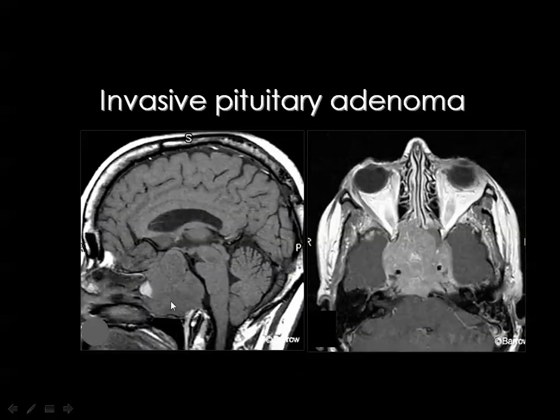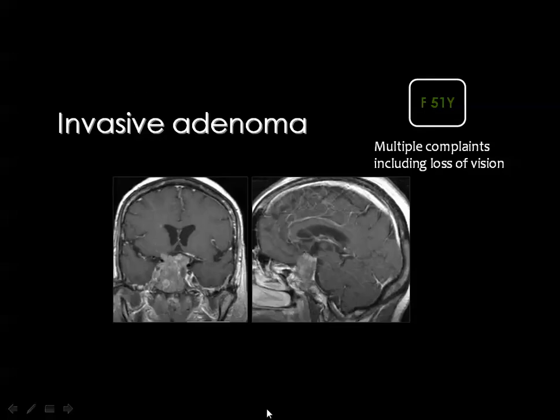This is a very big pituitary adenoma occupying the region of the pituitary gland and extending into the suprasellar area, reaching the optic chiasm, and also invading the cavernous sinuses bilaterally. You see the tumor tissue lateral to the internal carotid artery on both sides, and it has also invaded the skull base, filling the region of the sphenoid sinus and bulging into the nasopharynx as well. There is destruction of the clivus and encroachment on the prepontine cistern.